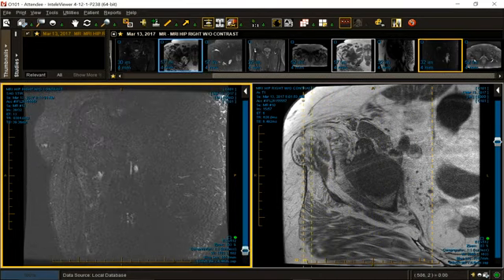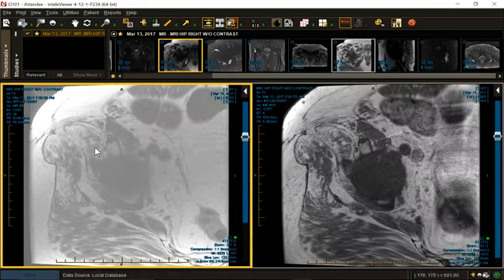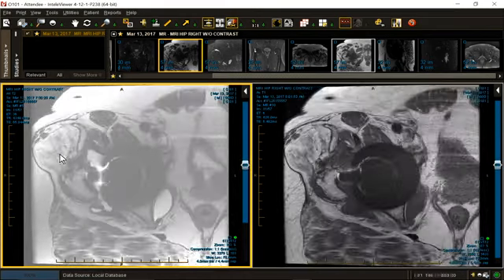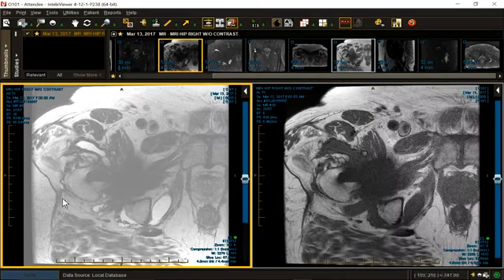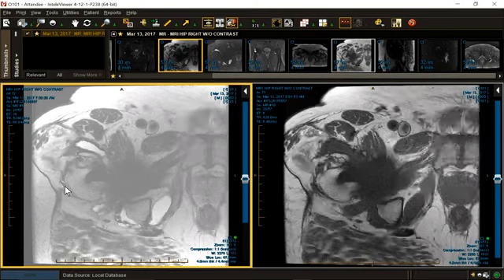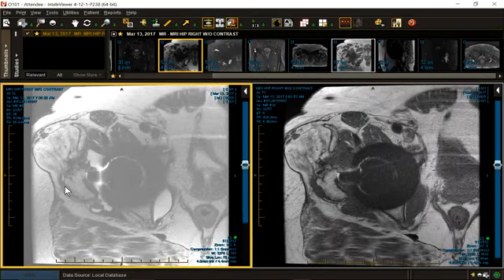Unfortunately, too black to see, we'll have to look at the muscles in the axial and look at what's left of these muscles, the minimus and the medius. Virtually nothing. And there is no tendinous insertion of the gluteus medius. There's just these small little fibrillated residual fibrils. So there's really not a lot you can do.